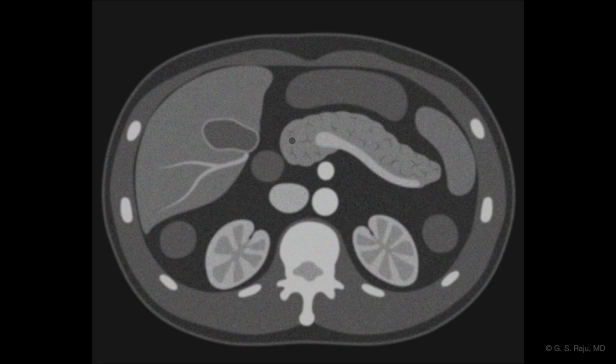And when I'm on service, my trainees struggle looking at these images and making sense out of them. To help them, I'm creating this tutorial to go step by step. To learn this, you should go back and look at the basic anatomy, and then you'll appreciate this anatomy much better.